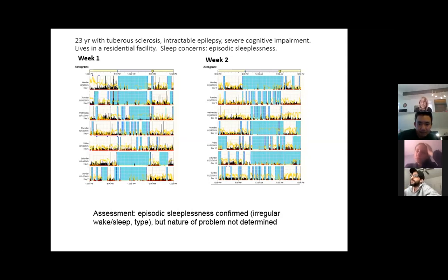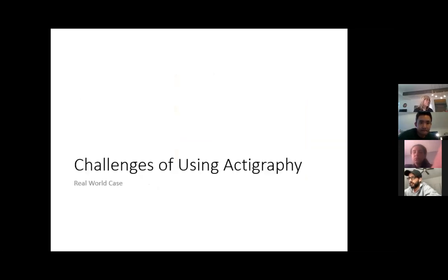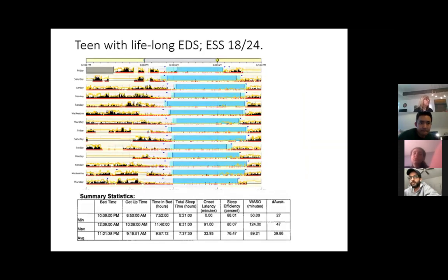I don't know. I'm not going to do a full montage on somebody like this in the sleep lab. Our staff can't manage somebody like this and do a study. But I thought her actigraphy was pretty interesting. This is bad brain, very bad brain. But she does have times when she can sleep, and then sometimes she can't sleep. I can't tell you why that is, but I made a pretty picture of it. I think this is my last case.